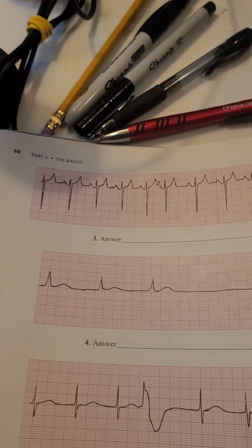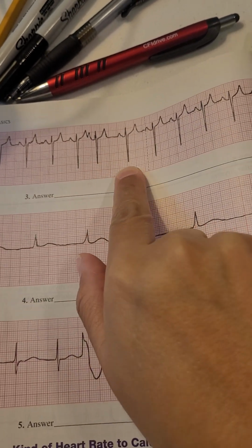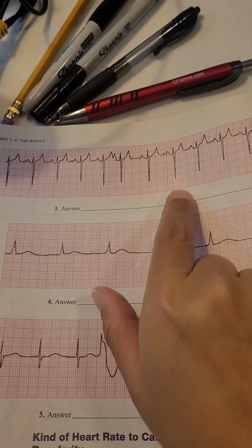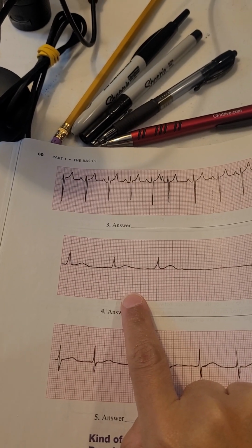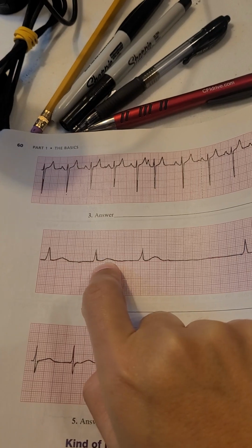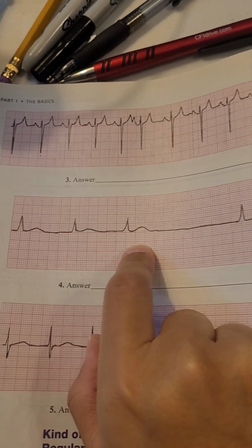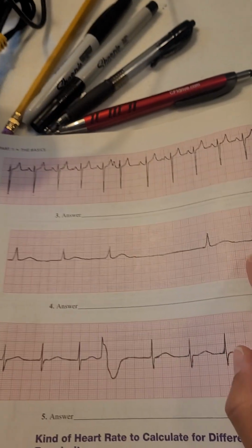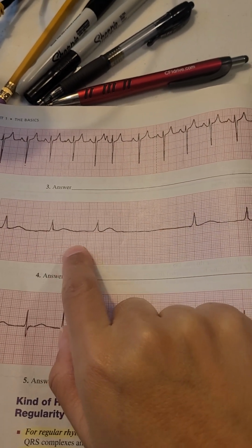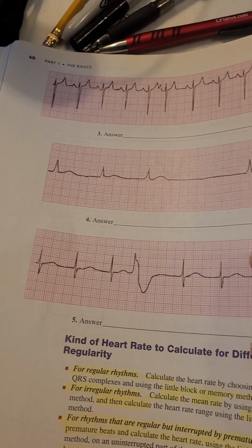Let's look at the next one. It looks constant. It has a premature beat there, and then the rest looks consistent. All right, so that's regular but interrupted. This one, just eyeballing it, I would need a caliper. I don't have a caliper. I'll show you what a caliper looks like, but I don't have one, so I don't know exactly. It kind of looks regular but interrupted by a big pause, but I'm not 100% sure because I don't have the calipers, plus there's a little bit of beats in this one. I can't really tell. I'd have to keep looking at the rest of the rhythm to see what it's doing.